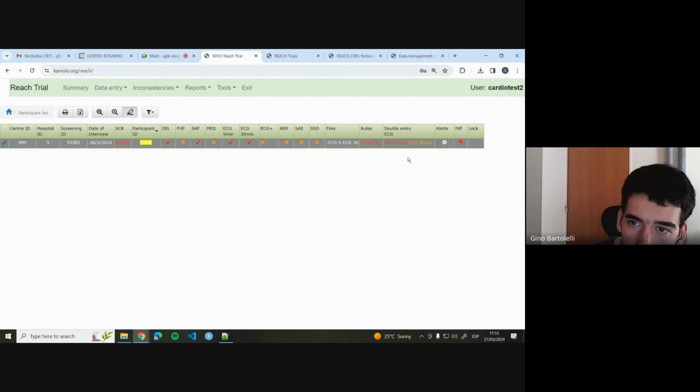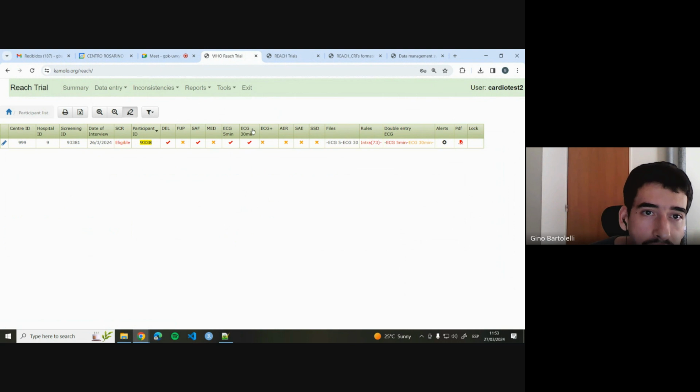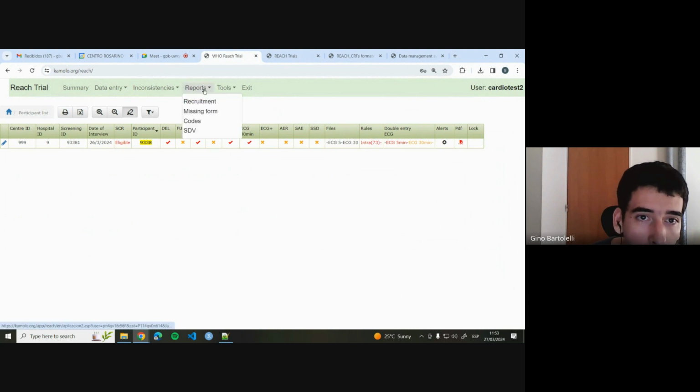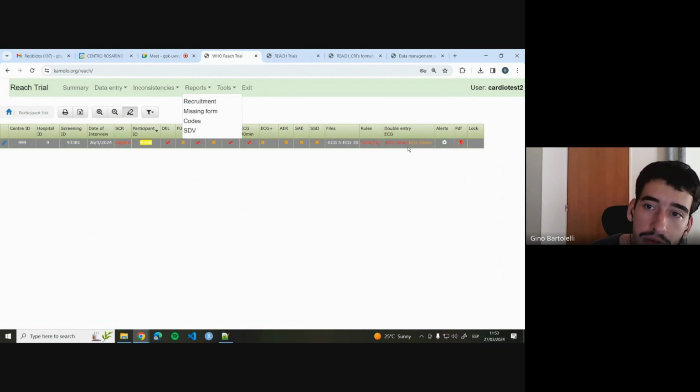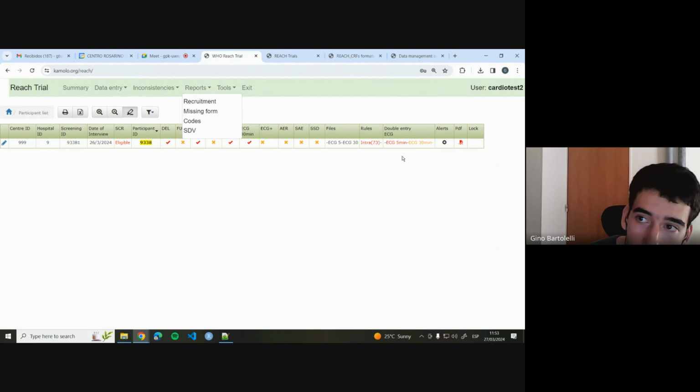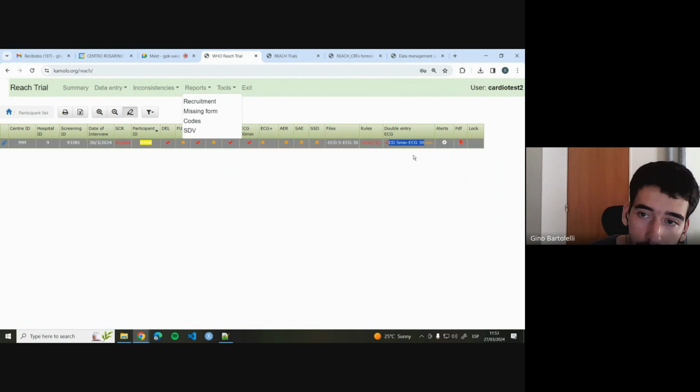I think that at this point it's relevant for us to check once again the missing form report. What is going to happen right now is that for cardiologist 2, the system won't claim the ECG 30 minutes because we have already uploaded it. But for cardiologist 1, the system is still going to claim it because it hasn't been uploaded yet.